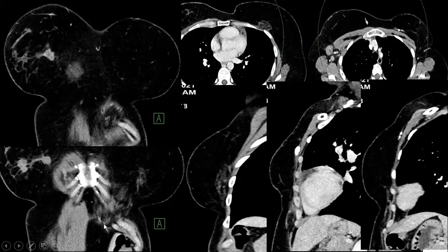It's missing. Can you see it physically? Can you see it reflected? Can you see it here? Reflected, but it is atrophic. Reflected because it's not working. Reflected here. You see, this is the muscle. It is reflected. So the CT is helping us even to show the muscle flap. The muscle is reflected from the abdomen into the left breast, making the reconstruction of the breast. This is the muscle here. That is why it's atrophic, and contains fat.